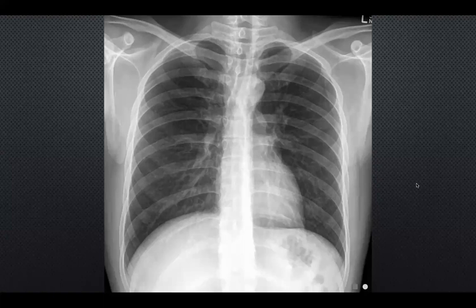That's great. Excellent. So in summary, what would you say about this chest X-ray? Is it normal or abnormal? It's the normal chest X-ray. Brilliant. Yeah, exactly. So I just started off with a normal chest X-ray, and that was great. You went through a system, and whatever system works for you, you don't have to stick to the one that I've said.